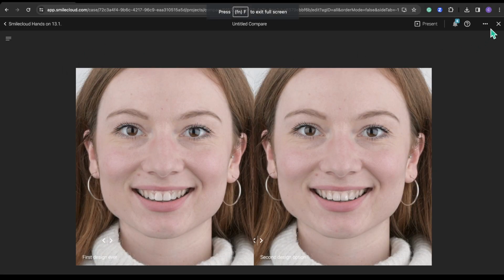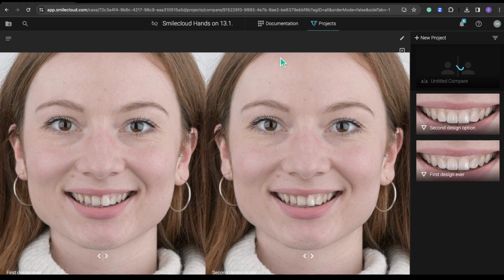This is a cool feature because the patient gets added value in this designing process, because they feel more involved, and it's a huge selling point in this case because it's a special experience to them. You're creating a special process which they haven't seen before, and it's quite priceless, and it's working really well for us. So let's say we've chosen one design, and this is going to be this one. Okay, you press the escape key, let's press X, and you can see everything you designed, and every project is going to be saved on the right side.